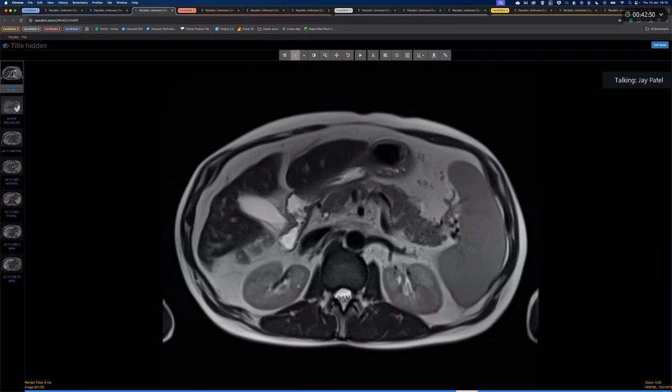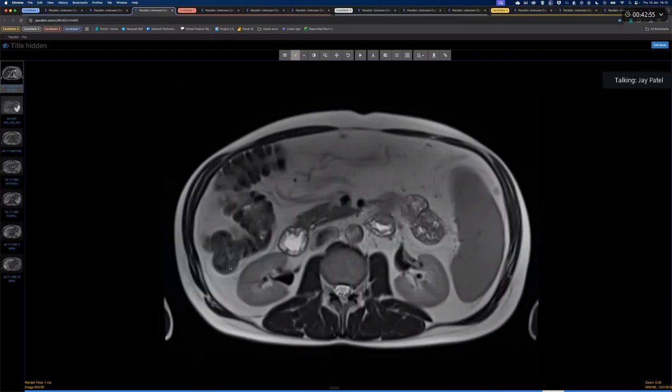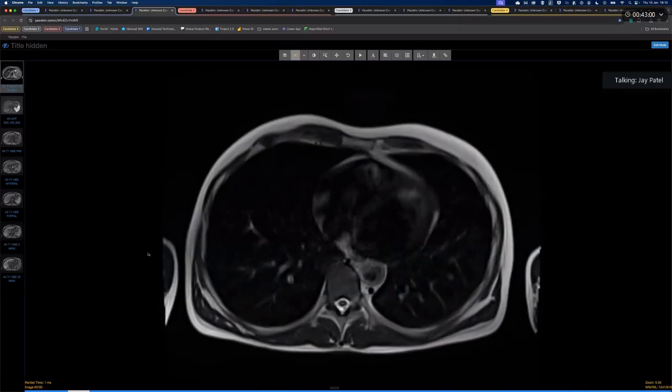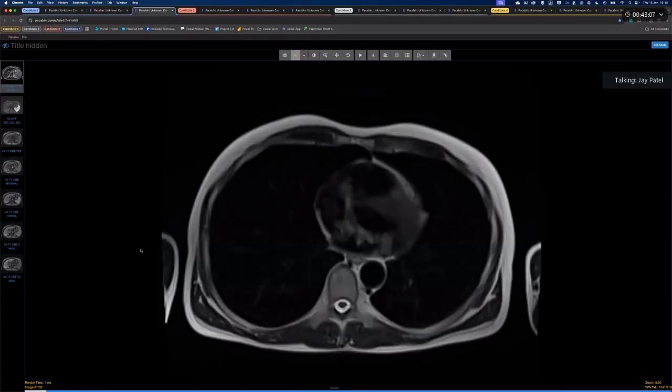Okay. Good. So let's run through this case. Well done. I would personally have been petrified if you showed me an MRI liver for my 2Bs. I think you did well. Remember, typical presentation of atypical things or atypical presentation of typical things. Generally, if they're going to pick a slightly weird or wacky modality, like a post-contrast MRI liver, you're going to get something that's probably relatively simple.